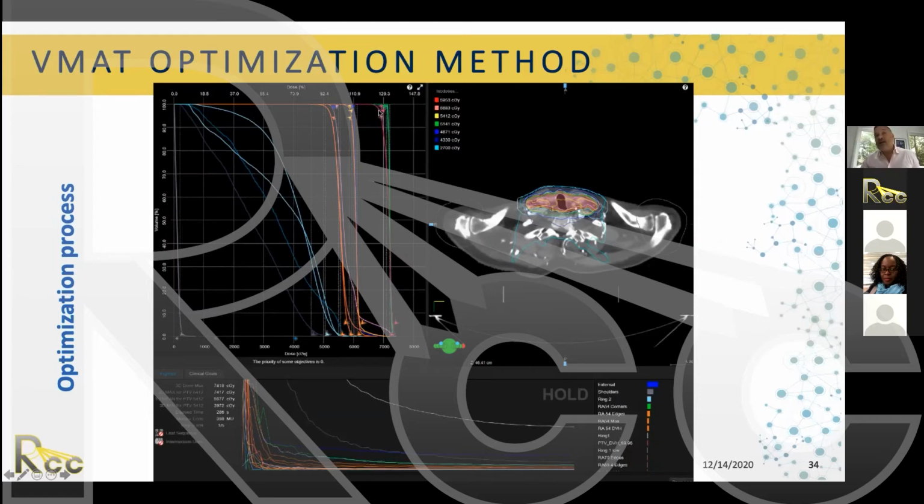I mean, they're almost there. We will make it better eventually later, but it's good. And these are the two rings that you have, upper limits. They're not quite there, but that's something that we can tweak at the very end also.